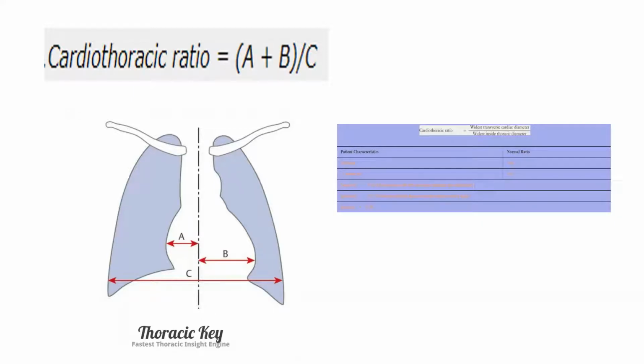One, two. The position. As you said, AP or supine, PA. The patient lying supine, exactly. Yes. And the other thing is the tilt or rotation.